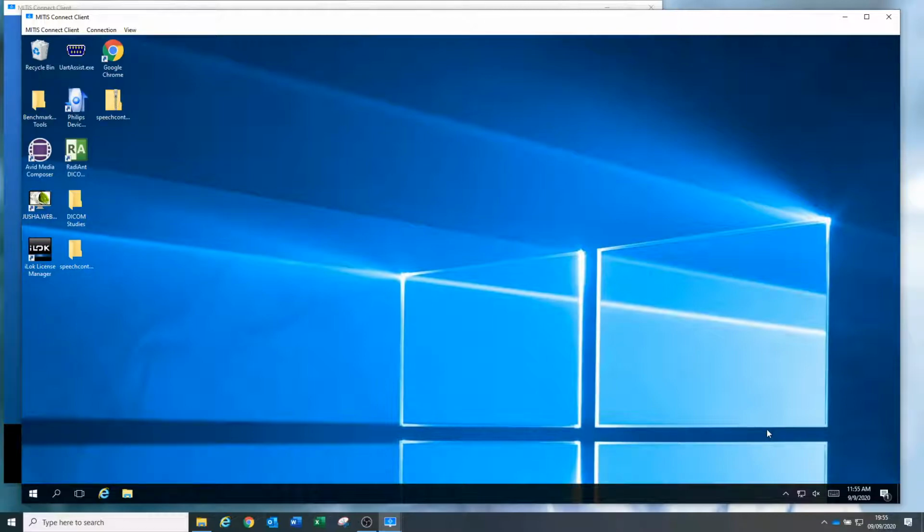At this point, depending on what user is logging in, whether it be a clinical user in accident and emergency, or outpatients, or wards, or a specialist consultant such as a radiologist, cardiologist, or pathologist, we can now choose where we want to take this. For the purposes of this demonstration, we're going to be concentrating on the specialist user, so the radiologist, and we're going to load up a couple of DICOM images and really show you the power of the MITIS client and the communication stream, and more importantly, the lossless aspect of the session.